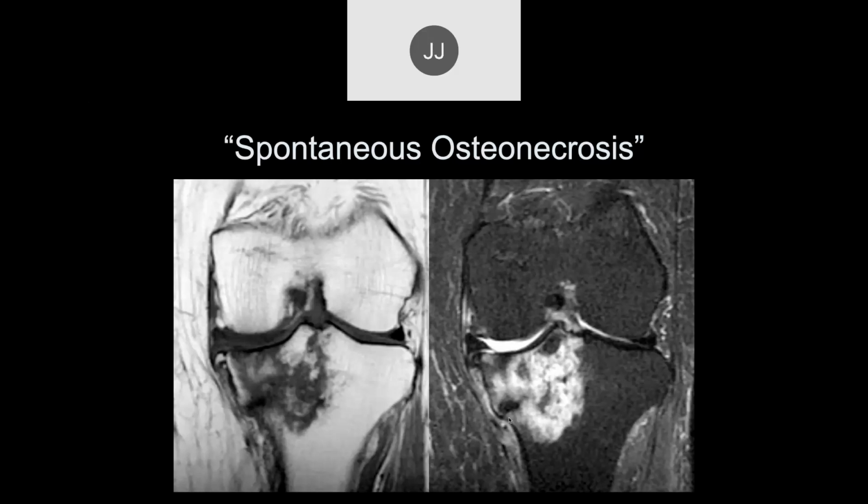So this was another debate in years past, the term spontaneous osteonecrosis, and that was used for many years after we really pretty much proved that these are all traumatic injuries. So this is really a subacute traumatic impacted fracture.